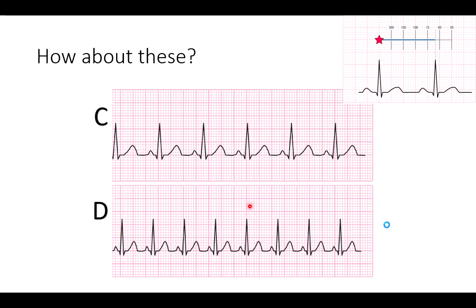Let's go down to this one. This one right here. That caught my eye. So I could go in either direction, right? If this is a regular rhythm, it wouldn't matter. 300, 150, 100. We're somewhere right between 150 and 100. Let's call this 125. Now let's do the same thing going backward. 300, 150, 100. Again, somewhere between 100 and 150. So my example here would be, again, 125. Regular rate, regular rhythm. We can do this counting and math in that regard. So let's go forward here.